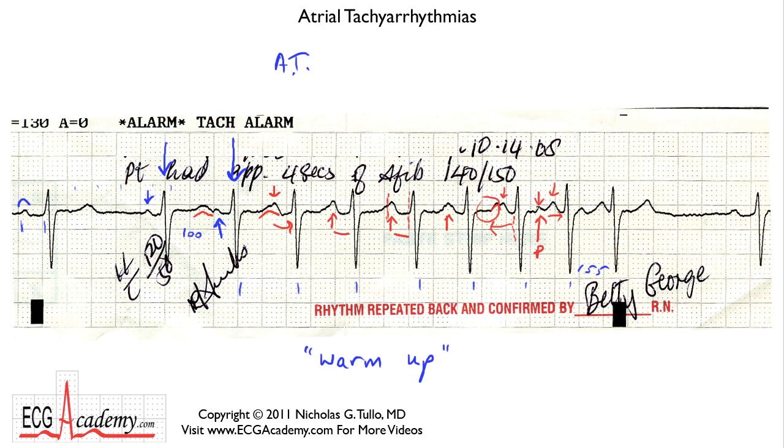So because this is the signal that's moving, it's likely that that's the P wave, but I can prove it to you. Because when you look at this beat, you can see a bump right there, and that cannot possibly be the T wave because that QT interval is not physiologically possible. And this conducts to this QRS with a fairly long first degree, somewhere about 280 milliseconds.